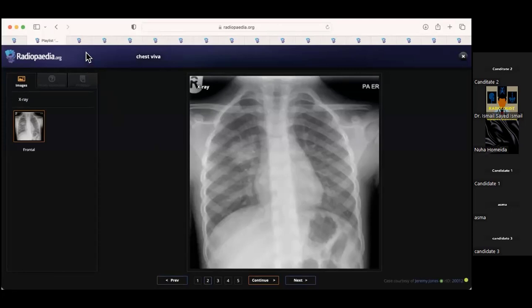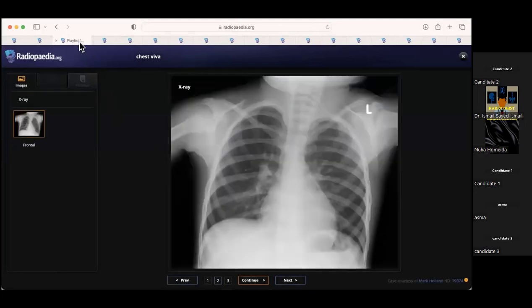Okay, so that's a rounded pneumonia, strep pneumonia. It's a community-acquired pneumonia, so strep pneumonia would be the commonest. Less common causes include Haemophilus influenzae, but we don't see it these days because of the vaccination. And follow-up, yes, it's appropriate doing it in 4 to 6 weeks. Okay, so next case. This is another child, presenting again with shortness of breath.